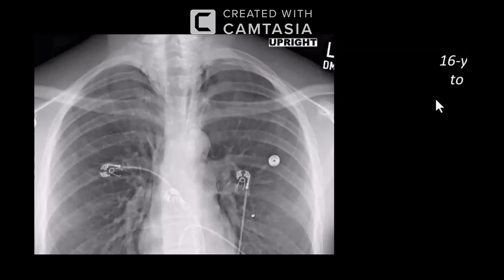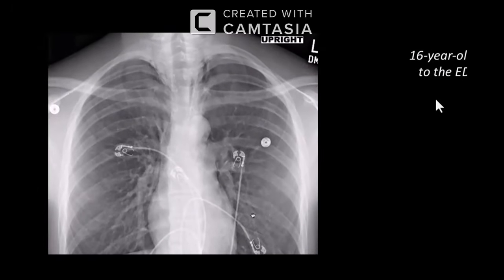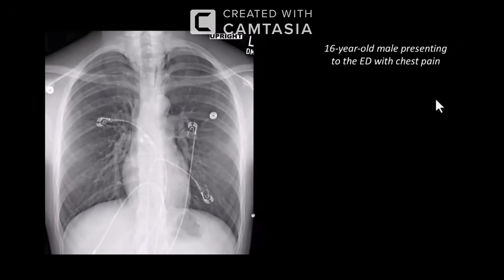I could not find a visceral pleural line at this area, but yes, the air lucency seems to be extending along the neck region within the soft tissue of the neck. So this is suggestive of pneumomediastinum with a possibility of subcutaneous emphysema.